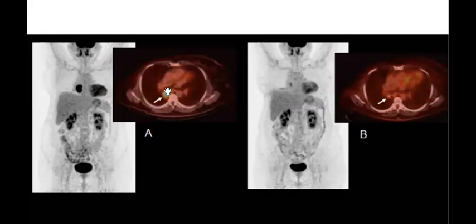Okay. So let's go to this case and see that this patient has something here. Then maybe you can say, as a first impression, is it a nodal lesion, lymph node, or is it soft tissue? Maybe lymph node. Do you think so? Yes. Maybe. So if it is a lymph node, we can see what happened here after the patient took treatment. So you can say that this patient has regression, right?